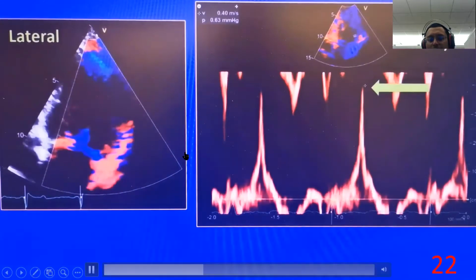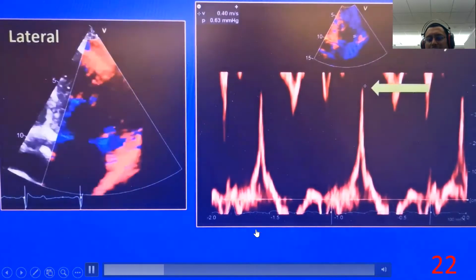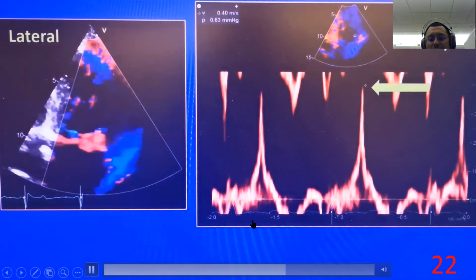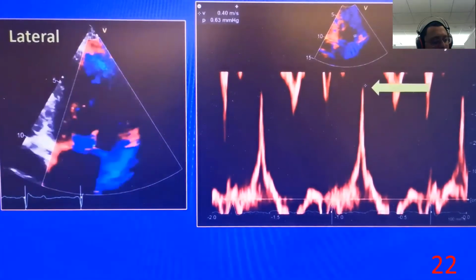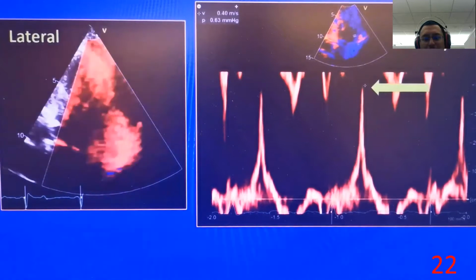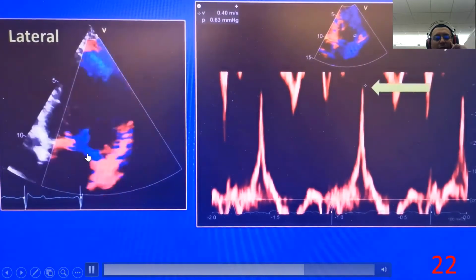So this again shows you putting a tissue Doppler there. And this is the sign. Saravanan, tell me what is the name of the sign again? Pickelhaube, I don't know how they pronounce it. But it's a Pickelhaube sign. So this is a Pickelhaube sign of mitral valve prolapse.